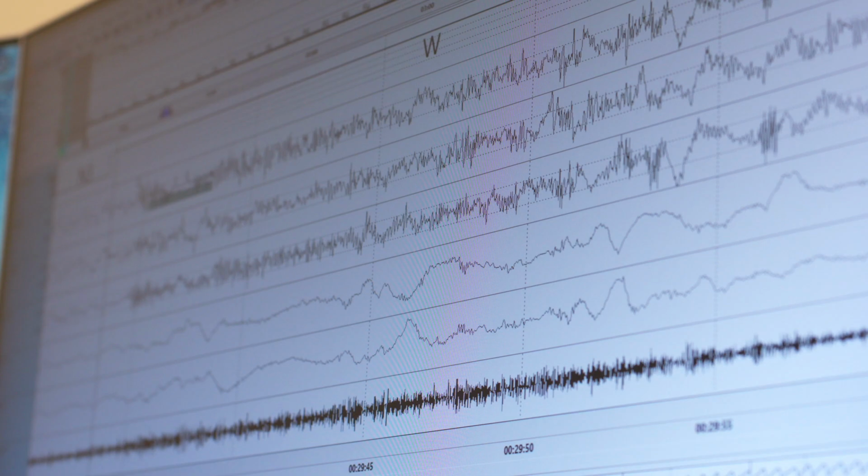So there's something else happening in the brain between being awake and asleep, right? Yes, that's exactly right. These sleep twitches, we've all experienced them before. When you're dozing off and you get the feeling that you're falling out of bed, that's when discharges happen again. And something like that could have happened here, of course. Or he heard a noise, something happened. In any case, he woke up really nicely again here.